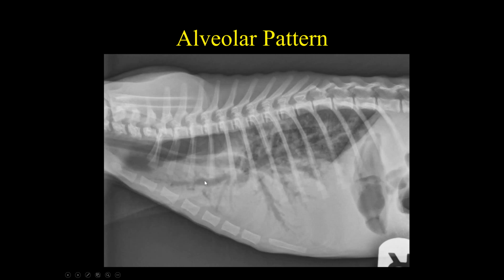And you see these because the surrounding lung now does not have gas or air in it, it has fluid in it. So if I remember back from our previous lecture, we talked a lot about this bronchus coming out in here. Here's the trachea, the bronchus branches off the trachea and comes out to supply air to this lung lobe.